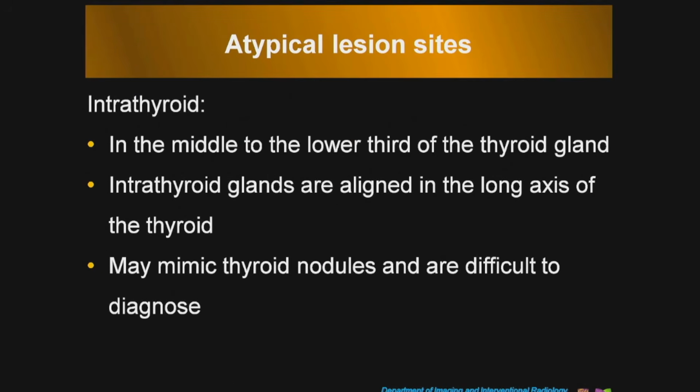Atypical intrathyroid. Do not disregard an intrathyroid parathyroid adenoma. When you are searching for parathyroid, any hypoechoic, solid, flat or oval nodule in the long axis of the thyroid, start thinking, can this be an intrathyroid parathyroid adenoma, because they are quite often located within the thyroid gland.